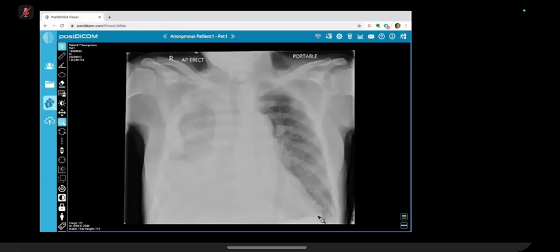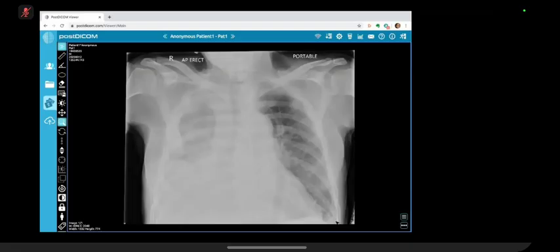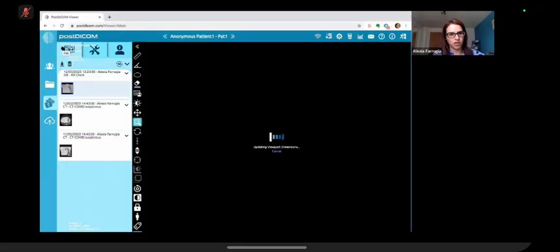But we're not really imaging the extreme lung bases, so we can't really comment about a left pleural effusion there. So we would compare to previous chest X-rays, or any previous chest imaging? Sure, yeah, if there is any available. And then you'd move on to a CT.